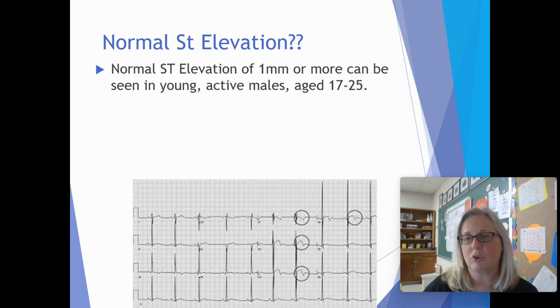Okay, so it's pictured down here in this. Why is my mouse moving over? I apologize. My mouse does not want to move over there. There it is. All right, so these that are circled here is an indication of early repolarization in young males.